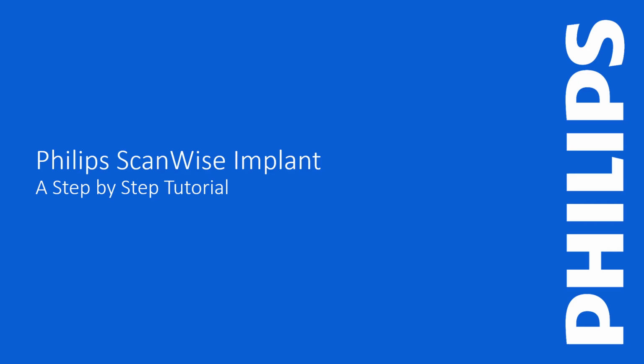ScanWise Implant allows you to save a tremendous amount of time by doing this. And also with the new reimbursement codes that are available, you can do your investigation and then use ScanWise Implant to save time at the end. It's also included on all new Philips MRI systems and is on many existing Philips systems in the field.